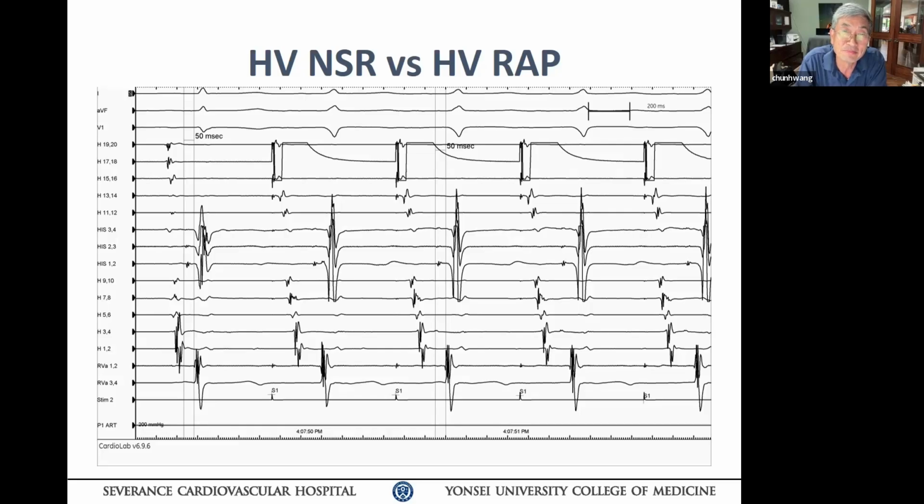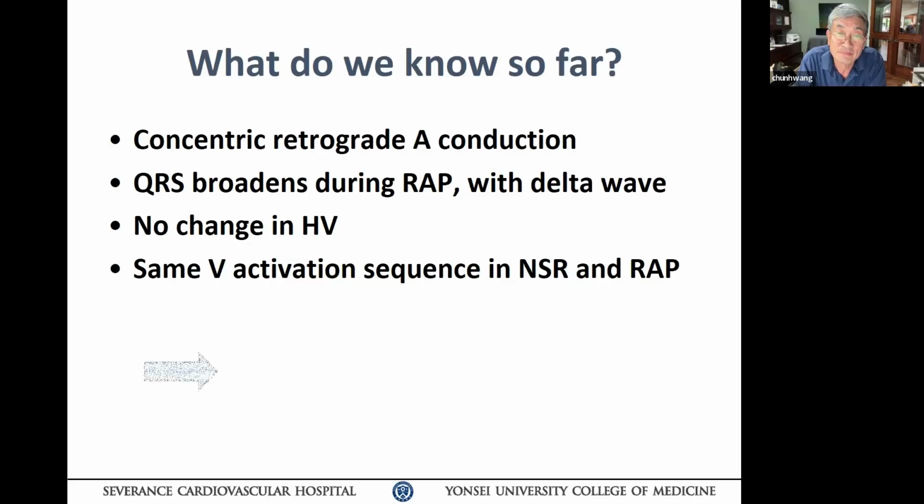All right? For the degree of proportional pre-excitation, you think about whether His to the lateral CS LV is getting longer or not. Because if this is nodal ventricular, there's no reason for it to change. But if this is an aberrancy, yes, it gets longer. Okay? So you look at the EGM carefully when you do that, please. Okay, keep going.